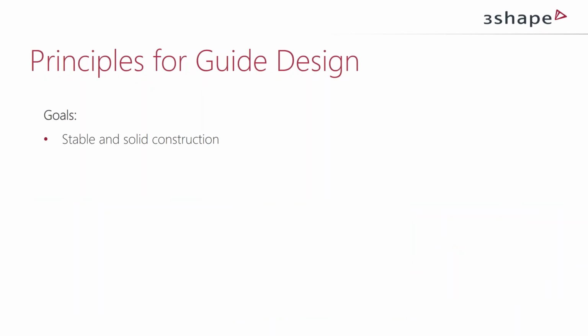The principles are that this guide is both stable and of a solid construction. This is important because then we can avoid torsion or tension or bending of the guide when placing it, and then later on also when using it with the drills. It has to be hard enough so it doesn't expand when we place it on the teeth or even fracture.